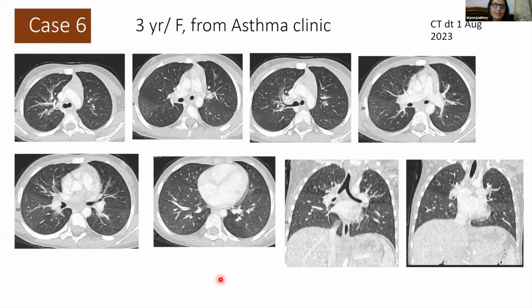So just one last case, a recent case. This was a 3-year-old girl who had wheezing and was being seen in the asthma clinic. This was a CT that we did on 1st of August 2023, and these are the images. This was reported as normal, which is quite understandable, actually.